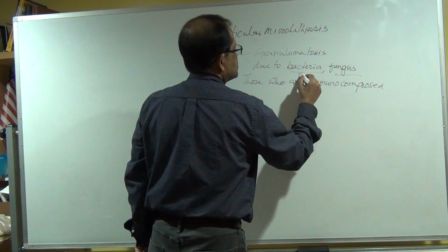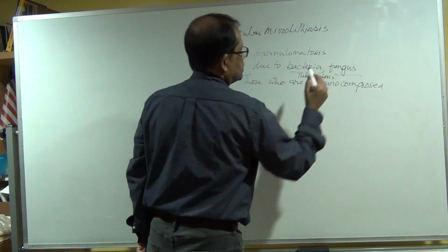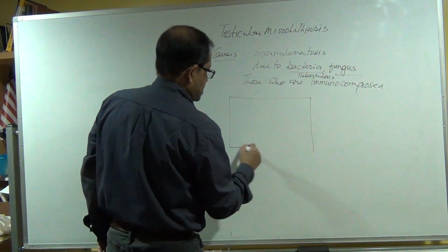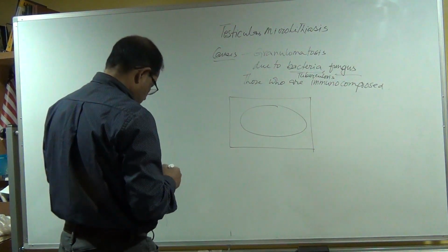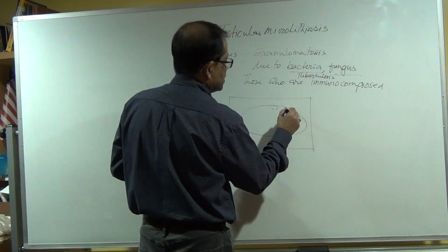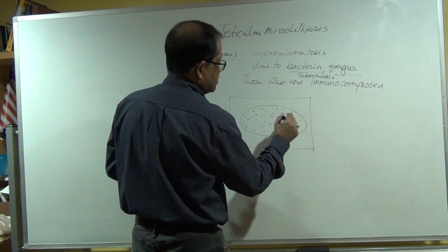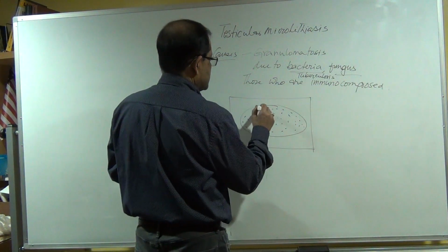You'll see tuberculosis. Testicles can have tuberculosis, and fungus. So in sono images, if you see this is the testis, then you will see the microlith, meaning calcium deposition all over the testis.